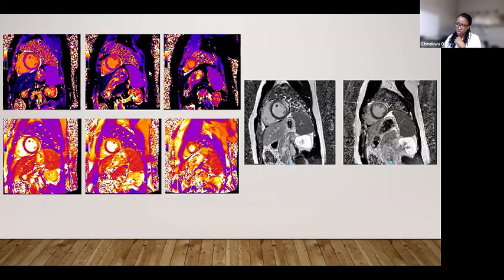So, we know that there is infiltration within the myocardium. It may be interstitial fibrosis, or it may just be inflammation. And with T2, we are quite confident that this is edema. So if we go back to that, and then we look at the late gadolinium images, we can see that the rest of the myocardium that had normal T1 and T2 time also nulls nicely and is black. So gadolinium has washed into this myocardium and washed out, but the lateral wall is hanging onto the gadolinium because it has expanded extracellular space. It's basically inflamed.